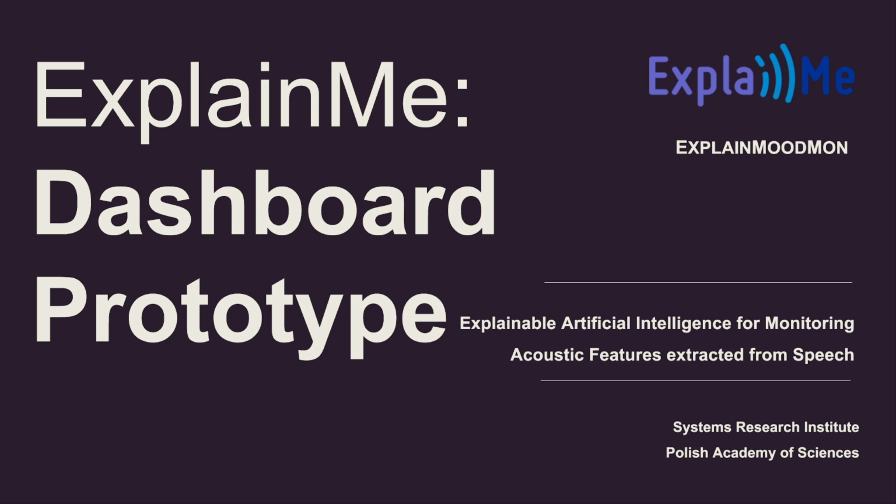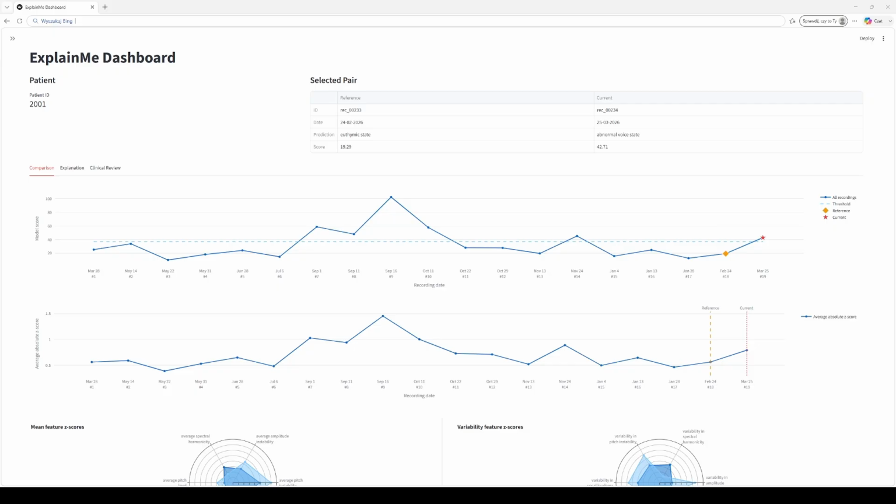In this video, I will present the dashboard developed in our project and show how it can be used to inspect patient-specific recordings, model outputs, explanations, and clinician feedback. The dashboard is designed as a decision support and monitoring interface.